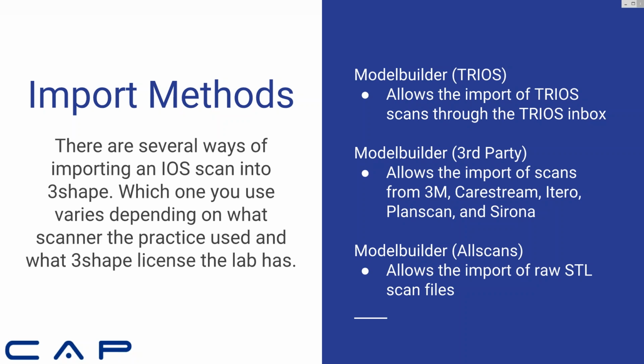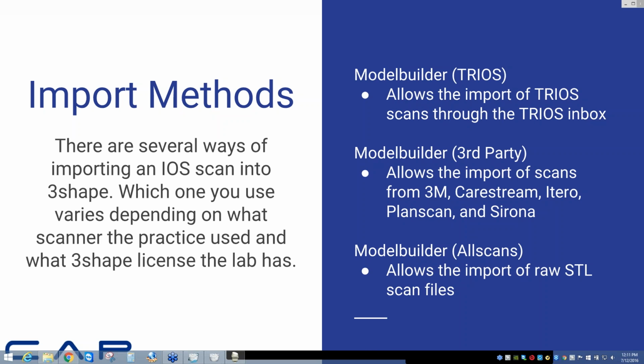For the simple articulators, unfortunately, you aren't able to remove any of the pins like the anterior ones. The only way to do that would be to make your own custom 3Shape articulator file, usually out of STL or DCM files, and you'll plug that into Control Panel.